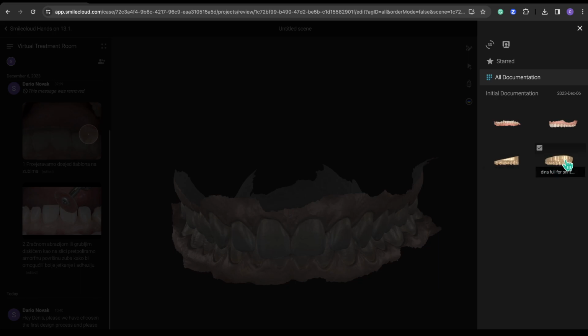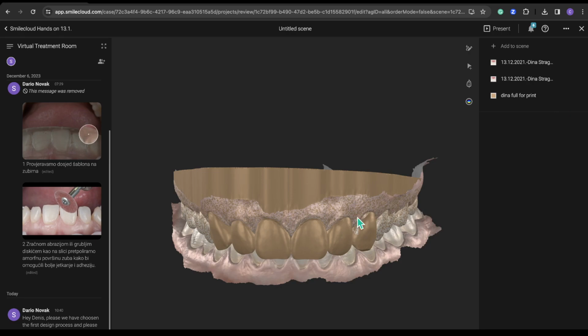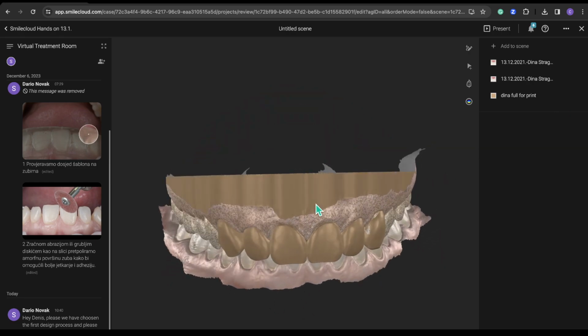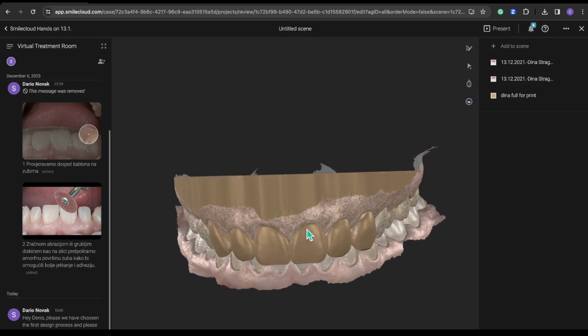So this is our design. So if the design was created using the same model, it will overlap immediately. But if they don't align perfectly, let me just show you. Let's say this actual design shows up somewhere else. Let's say it shows up right here. You want to align them to overlap.